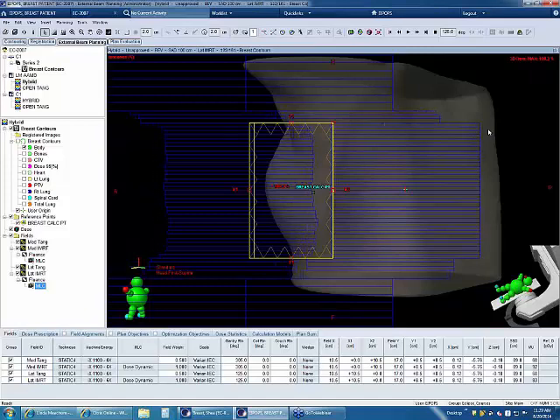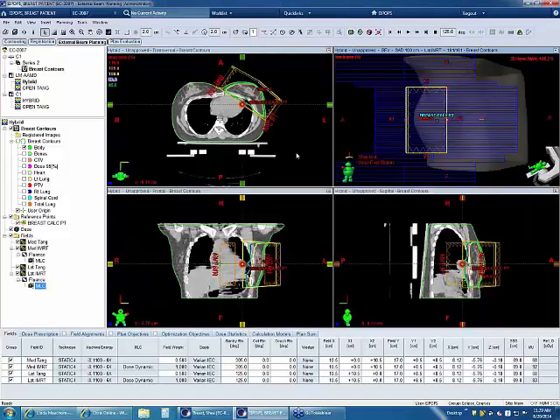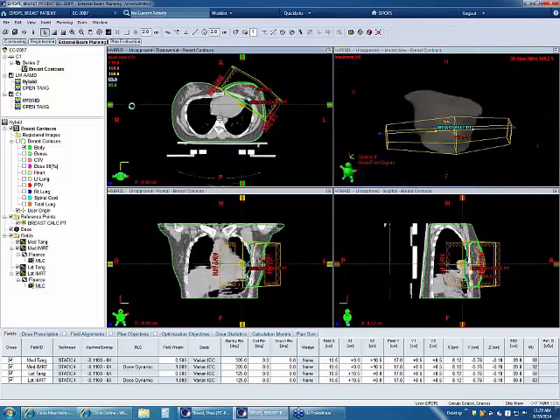Monitor units are reasonable. As you can see, the IMRT fields are grayed out. If 109.3 is too hot, then you can either edit fluence or you can also adjust the weighting. These can be adjusted right here. So either way, to get that down a little bit more. My hybrid that I did for you, I think is basically the same, 109.5. Yeah, it's basically the same with the same options.